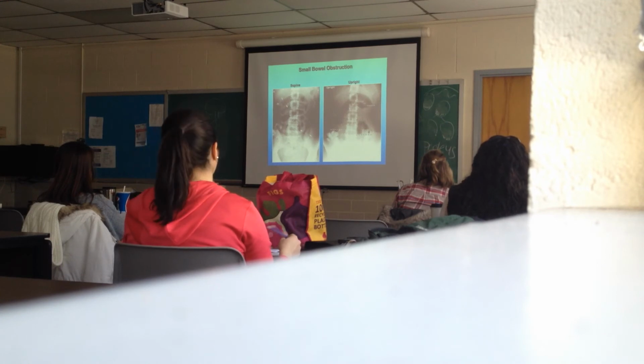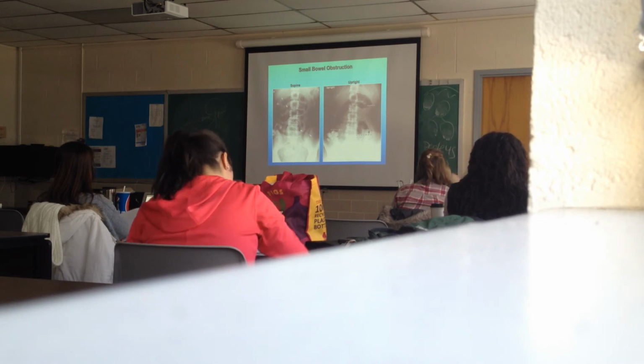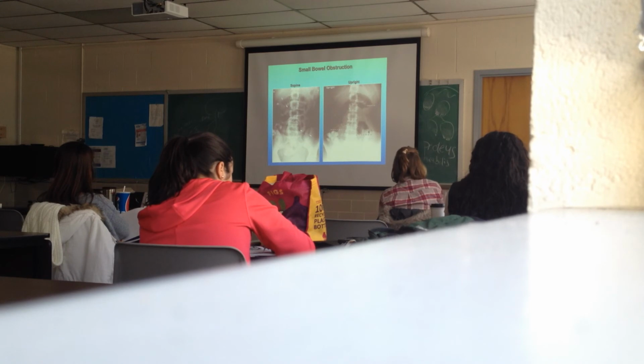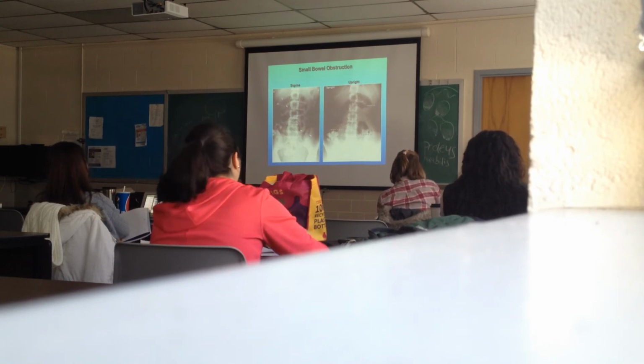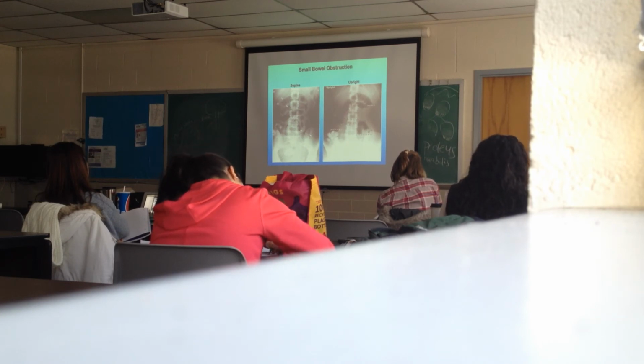Okay. And you're just looking at a radiograph without any contrast agent at all. Can you tell me if a GI tract is mechanically obstructed or functionally obstructed? Okay, and this bowel is mechanically obstructed. See the air fluid interface here.